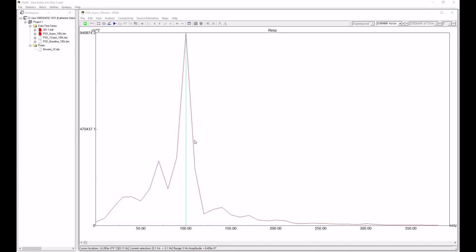Of possible interest, when you do this power spectrum analysis, you also may see other peaks. So there is this other one. You might end up taking an interest in this one, which is a little slower. It has something to do with their breathing patterns. A couple other smaller peaks at some others, but this one clearly dominates.